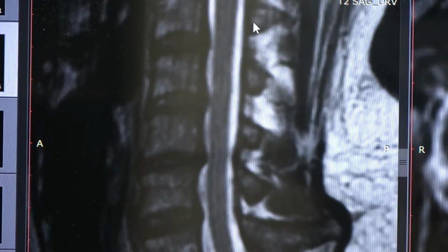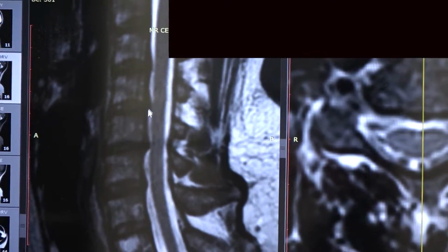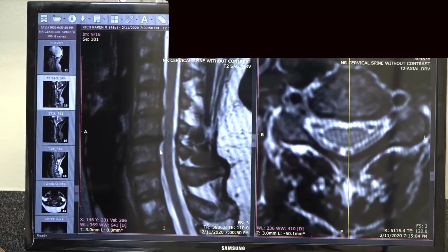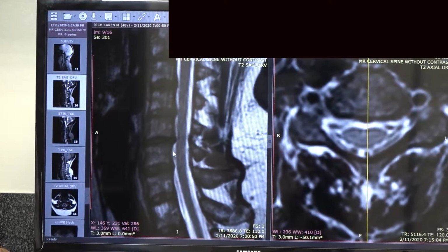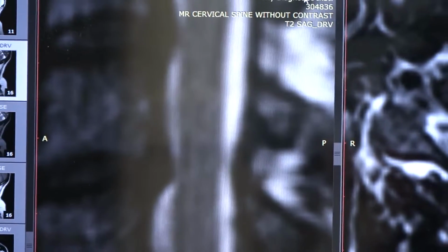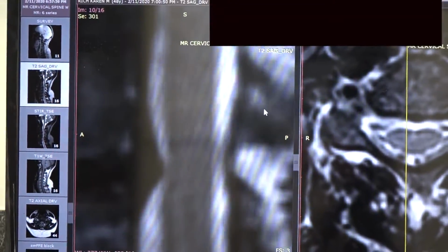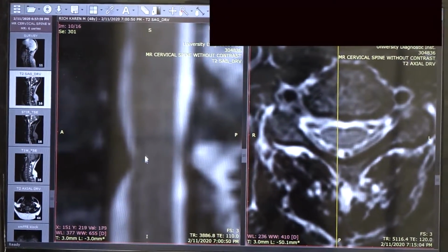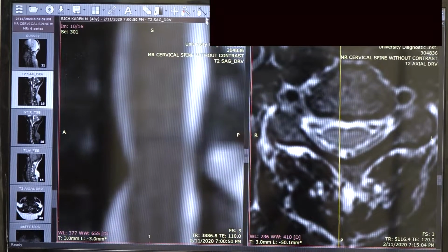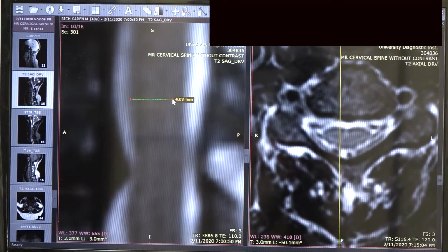The typical routine reading of a radiology of this MRI would reveal that this is probably minor type of bulges instead of actual disc herniation. But when you really critically analyze this and magnify and look at the distances front to back that show whether there is a normal caliber to the spinal cord, typically what I do is I magnify it, and I go to this tool I have here, which allows me to measure the distance front to back.